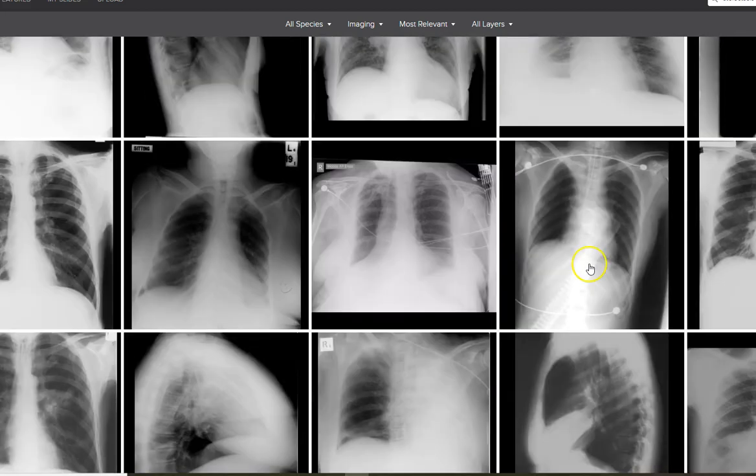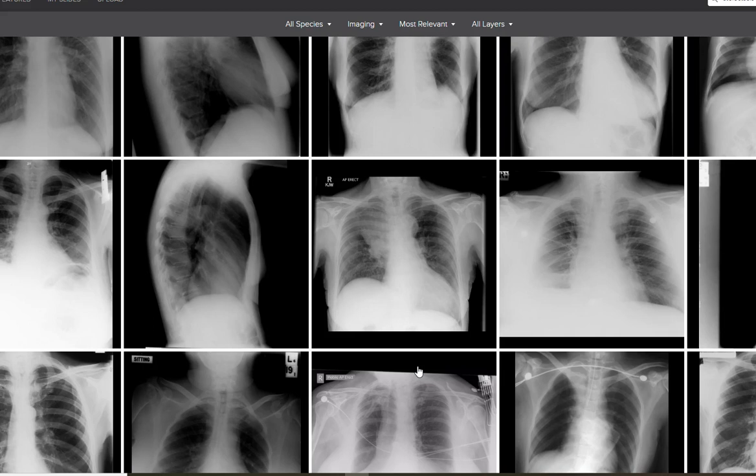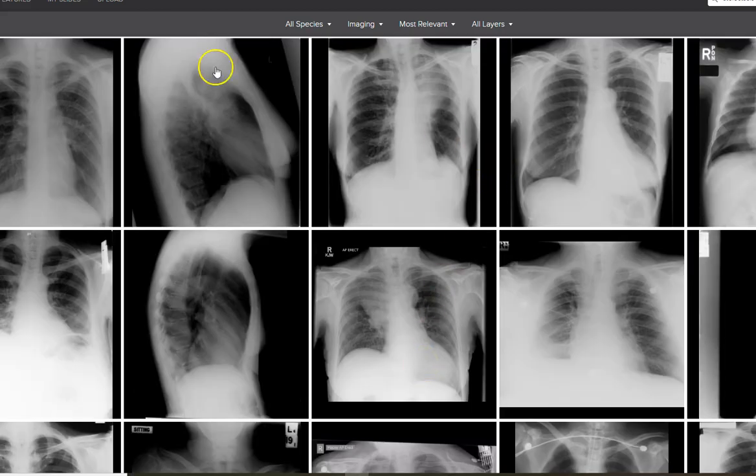So these are other images of some atelectasis caused by various things, I think. This one is quite interesting that they're calling it atelectasis, in that this to me looks like quite a widened mediastinum, and I wonder if there's some fluid in there, and there's some kind of interesting effusion that's then causing some atelectasis. Don't worry too much about the laterals. Definitely get your head around just the standard X-rays first. Yeah, that would be my primary thing.